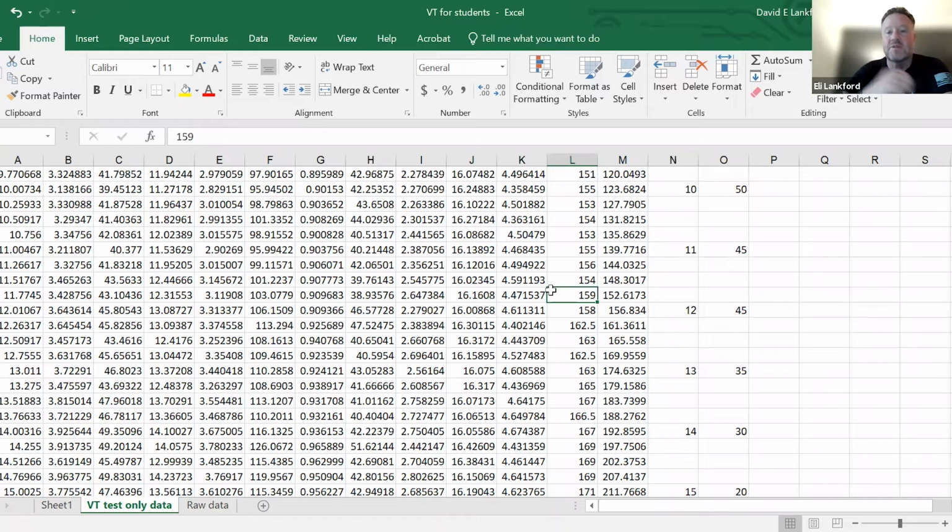So if I were to have this person do threshold training, I would say, let's make sure that when they're doing the interval component of it, they're above about 160. And then when they recover, they go below. I'm betting that this person's sustainable pace or heart rate is in that 155 range, something like that. So hopefully that helps you guys out and helps you determine how to pick ventilatory threshold from the Excel data.